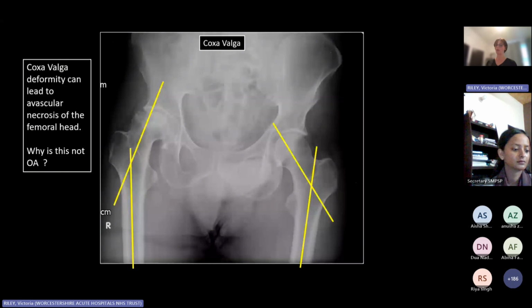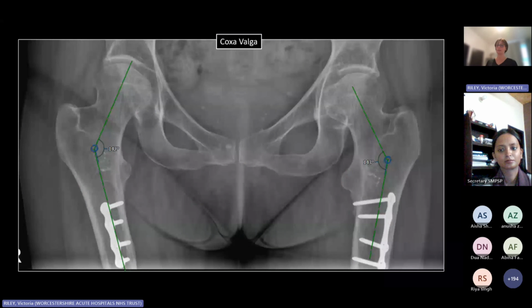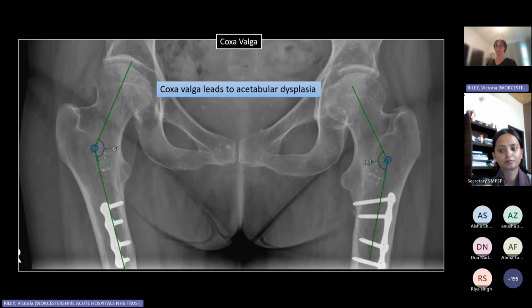And if you think back to our radiograph that we looked at with osteoarthritis, those findings are on both sides of the joint. So we have subarticular sclerosis on both sides of the joint. We have subchondral cystic changes on both sides of the joint with joint space reduction. So this is collapse of the femoral head secondary to avascular necrosis due to the load distribution changes affecting the blood supply to that femoral head. So again, this is something that you will be able to eyeball going forward. Have a look at your proximal femur. Does that angle look normal?